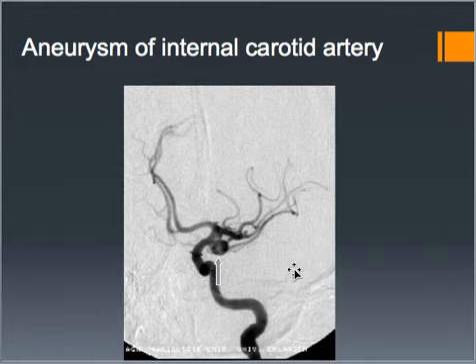Then if it ruptures, the blood is flowing out of the artery. There's a couple of different procedures that they can do for that. One is coiling. Once an aneurysm has ruptured, then they need to clip it. But if they can catch it prior to rupturing, then they can go in and put a coil in there, which will help prevent that.